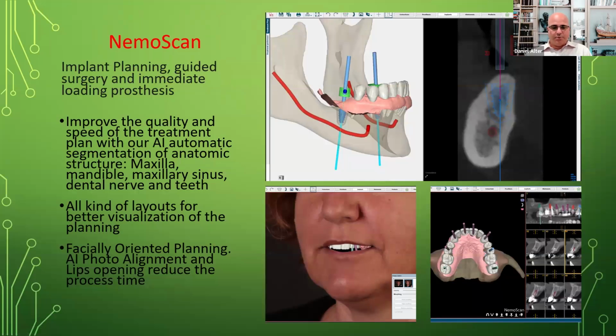Again, there's a little bit of a learning curve. I'm not going to sugarcoat it, but in reality, what you really need to understand is which landmarks to stay away from. So for example, on the mandible, you want to stay away from the mandibular nerve, and I'll show you how to identify and highlight that. Then on the maxillary, you want to stay away from the sinuses unless you're doing a sinus lift. Otherwise, the bone is really a matter of density units and where the anatomic structures are to truly be able to place an implant in a significant and viable way. You want to have proper stability, and this is the absolutely best way of doing it.